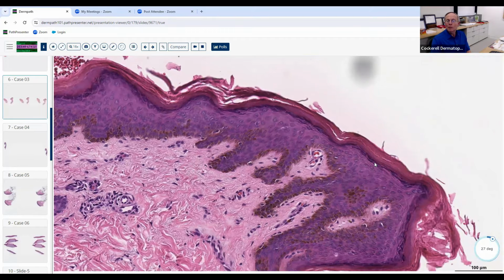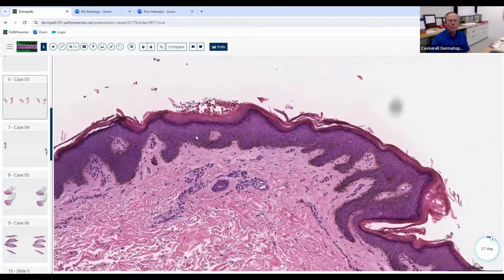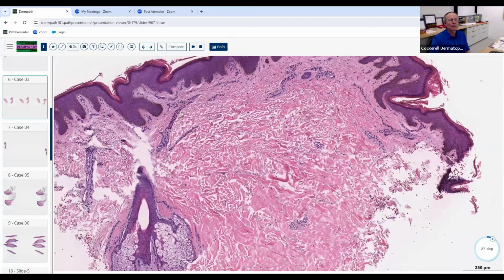In that situation, you expect to see alternating ortho and parakeratosis, both vertically and horizontally. We don't see any parakeratosis here, so that wouldn't be good here. It's obviously not psoriasis. It's obviously not epidermolytic hyperkeratosis. So that's ichthyosis, and I think in this case it was Ichthyosis vulgaris.